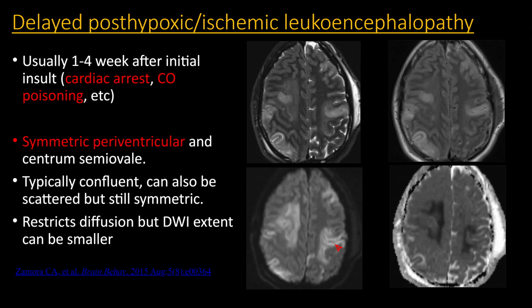Although, as you can see here, some of them are really normalizing, and they've already got some swelling, so consistent with a subacute course of the ischemia and the infarcts. So that was this person's initial event.